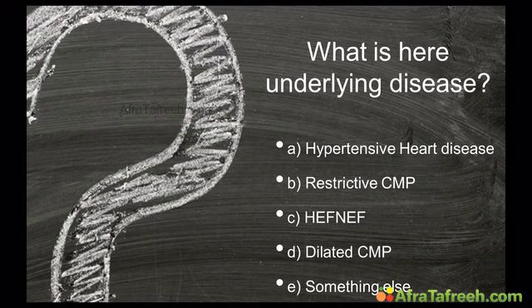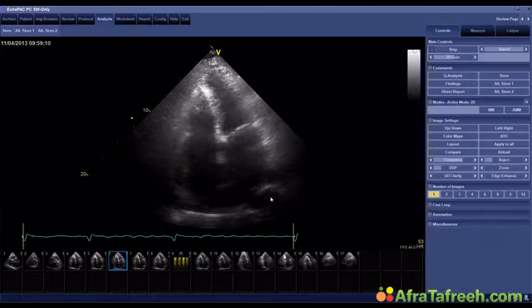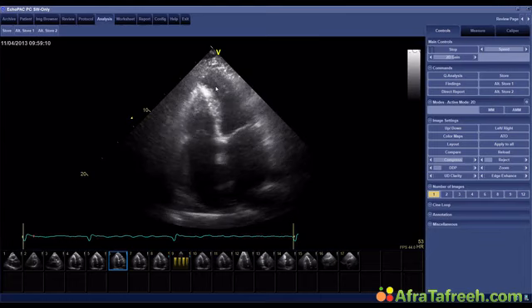You know, to tell you the truth, I do not have the right answer for you as well. But here are a few thoughts and a few additional bits of information. She does have hypertensive heart disease, but she was never really very hypertensive. Her left ventricular myocardium is thickened. She has hypertrophy, but that was not extreme. What really strikes us, if we go back to the loops I showed you previously, look at this here. She has very large atria, and very large atria usually fit together very nicely with restrictive cardiomyopathy. So thinking of restrictive cardiomyopathy, we put her through all sorts of tests.